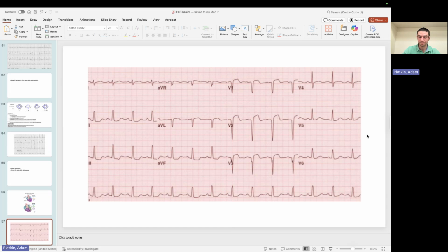Okay, next one. What do you see here? Pause your screen and think about it.